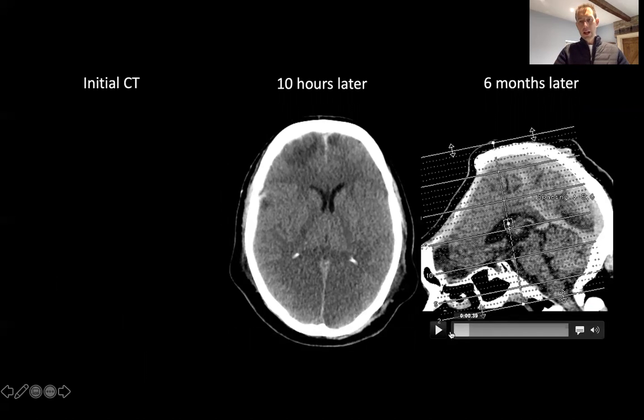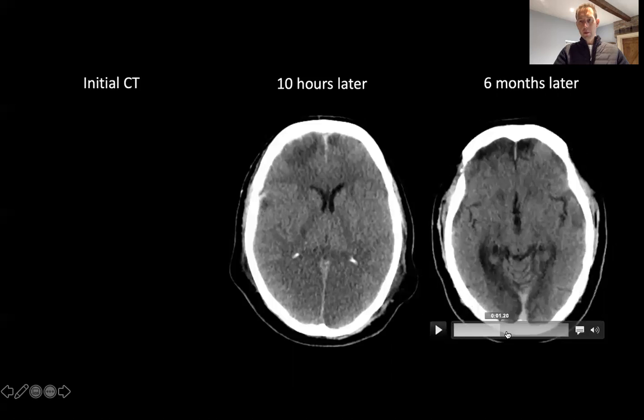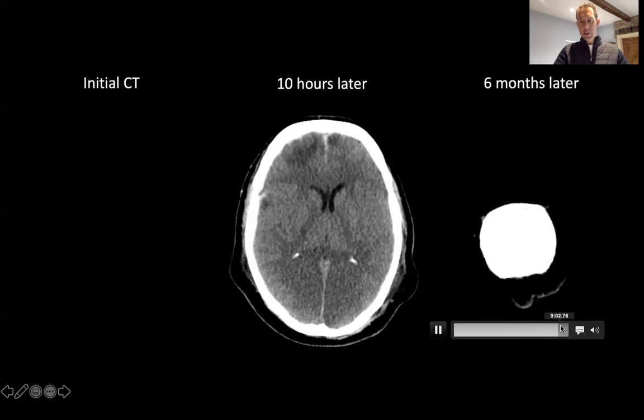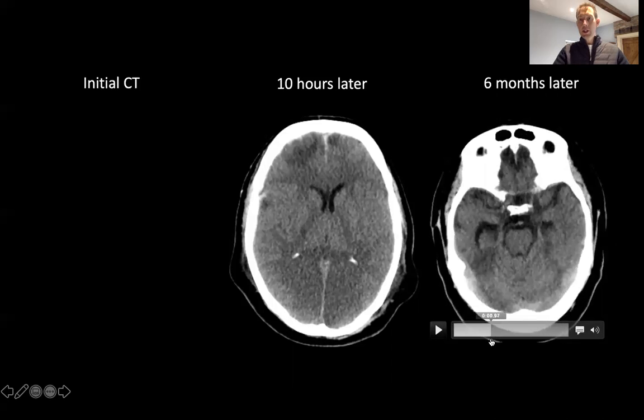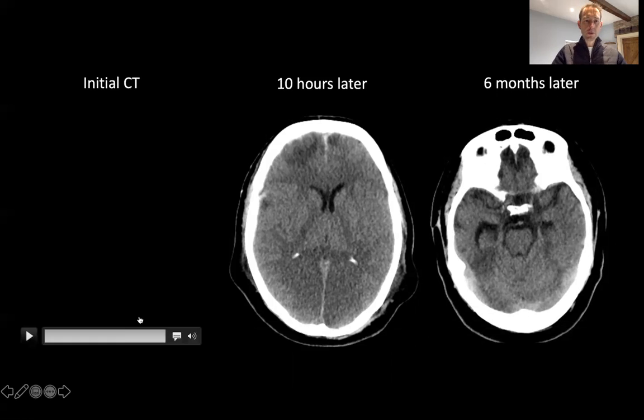And then, as you go down the line, you'll see this pattern where the volume loss exists in those posterior cerebral artery territories, confirming infarction. And then the anterior frontal lobe changes are all about maturing of the contusions.